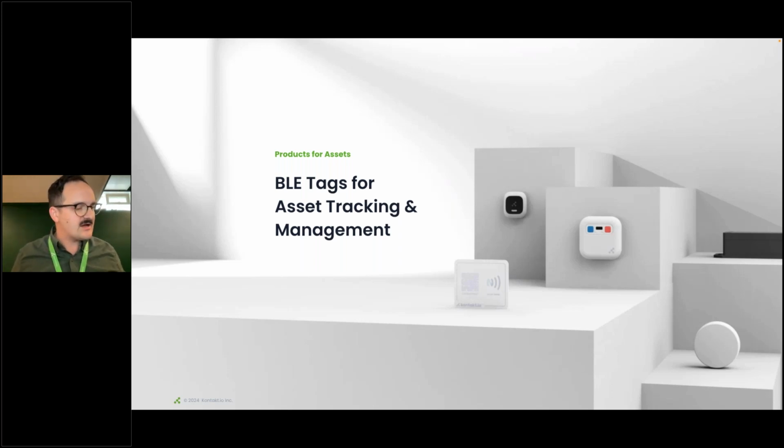So now that we've talked about the overarching platform, let's talk about the things that actually go on devices. I've got a bunch of them, but I'm only going to show a few today. I have what we call the Asset Tag 2. It's about the size of, well, actually it's about the size of the prize for today, an AirPod case. And we use this predominantly, it's a little larger, use it predominantly on wheelchairs, beds, transport related items.